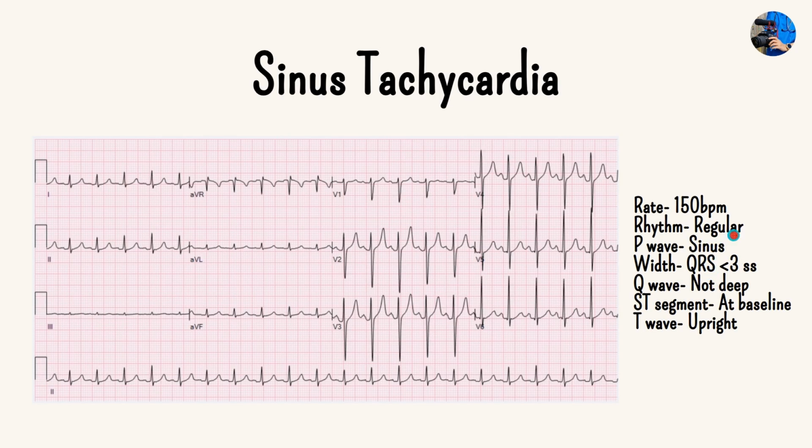But yeah, let's first of all talk about tachycardias. So, tachycardia is a fast heart rate. Specifically, any heart rate that's sort of above 90 to 100 beats per minute, we'd consider a tachycardia. But there's lots of different types of tachycardias. So specifically, if we have a look at this ECG here, we can go through our little algorithm. Make sure you have watched part 1 and 2 before you come, because this algorithm we talked through.